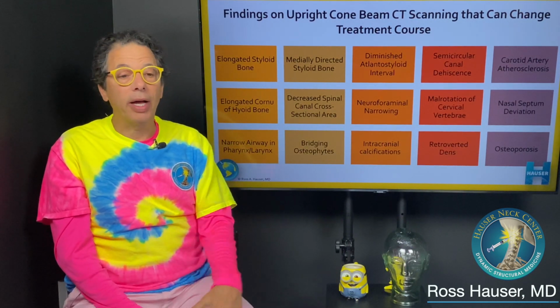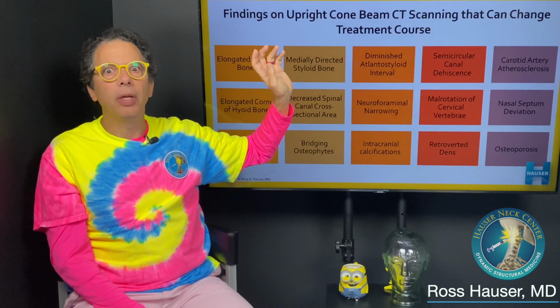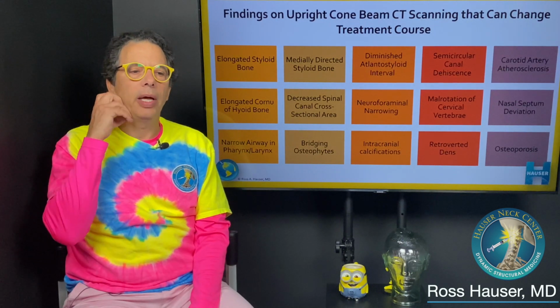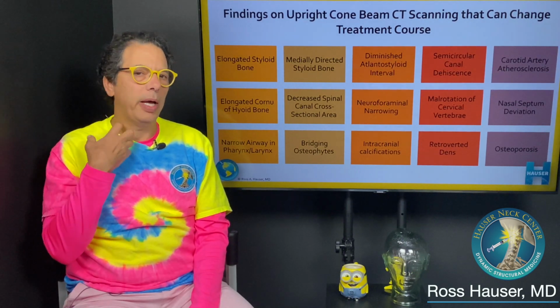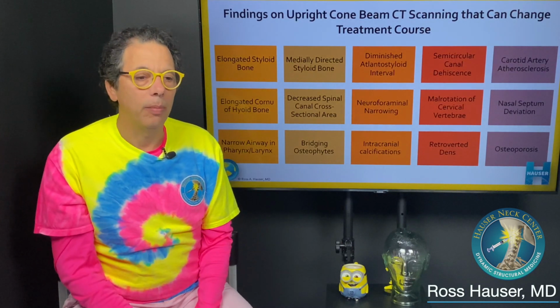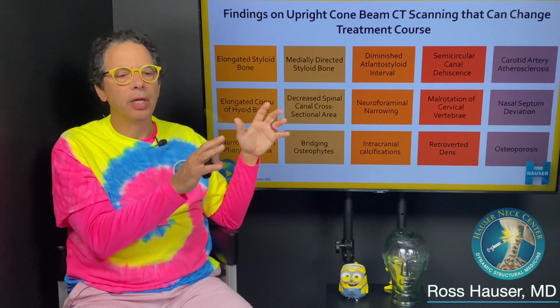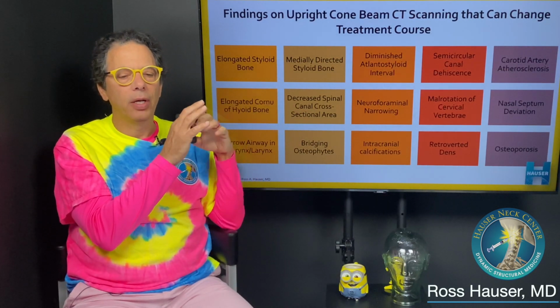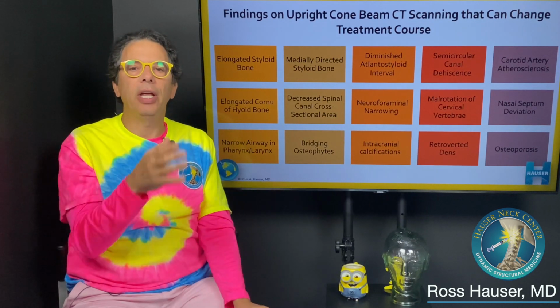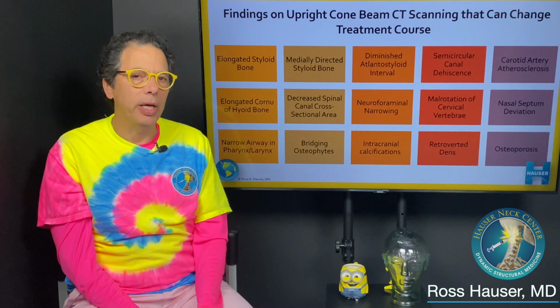I'll be making all kinds of videos in the future about breathing, because it's unbelievable how the cone beam shows where the narrowing is for the airways going from the mouth to the lungs. And I'm getting more and more convinced that there's a substantial subset of sleep apnea where the primary cause is actually the cervical curve. So that'll be really interesting.